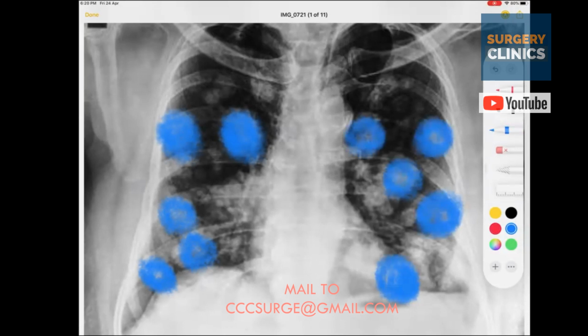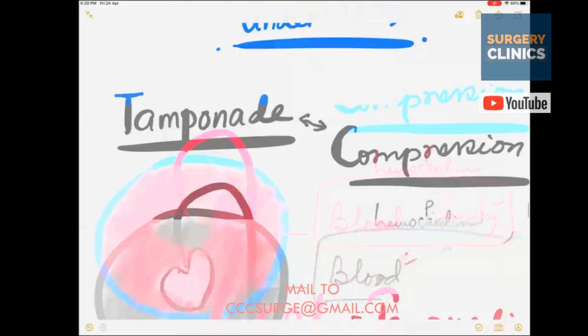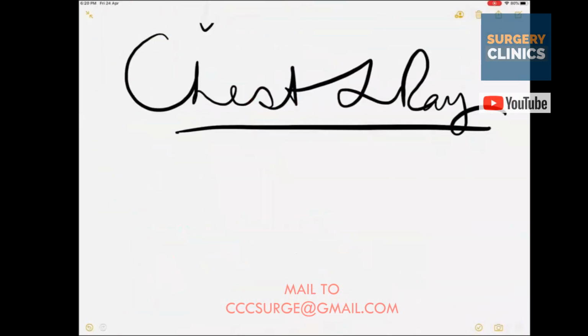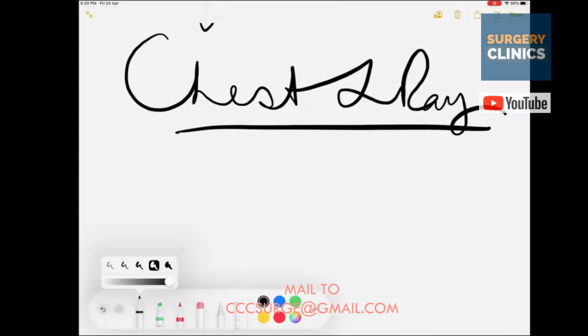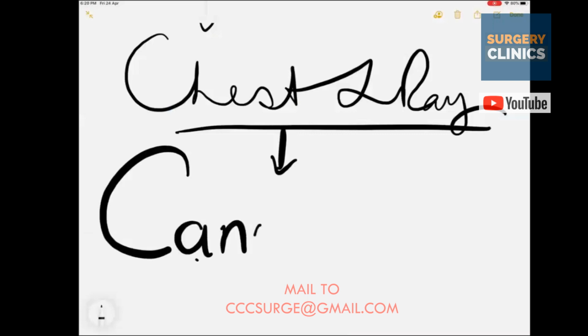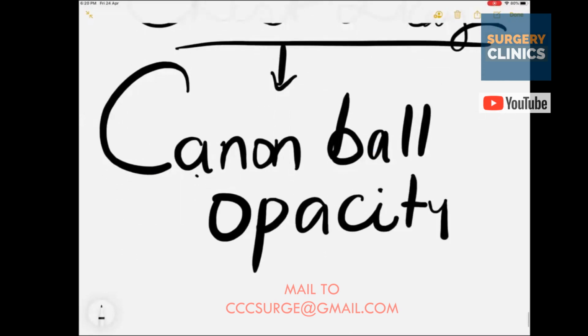So if I can get to see these multiple opacities, what are these multiple opacities called as? Remember that again, a very common viva question and an MCQ one. This picture that I've shown you is a classic telltale sign of something called as a Cannonball opacity. So this one is something called as a Cannonball opacity.